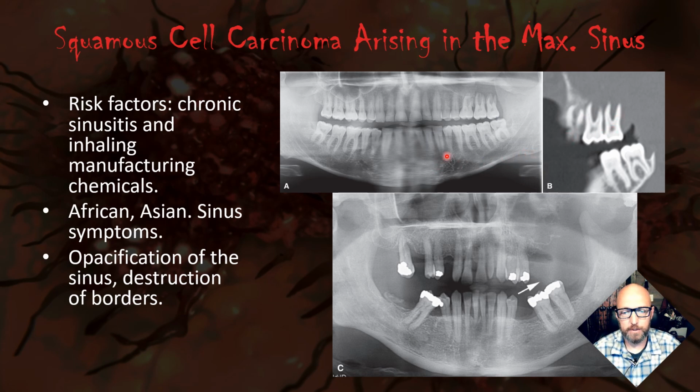It was a case that really shows how necessary it is to thoroughly investigate all your radiographs, especially in cone beam CT where you have that 3D view, where you see so many more structures than you do even in a panoramic. Although I pointed out all the different anatomical structures that are very clear in a panoramic radiograph, cone beam CT has probably 10 times the number of structures. You're looking now at the skull base. The floor of the skull has so many foramina, all the way back into the nasal cavity, all the paranasal sinuses, not just the floor and posterior border of the maxillary sinus. But there's so much more responsibility that comes with that with 3D imaging.